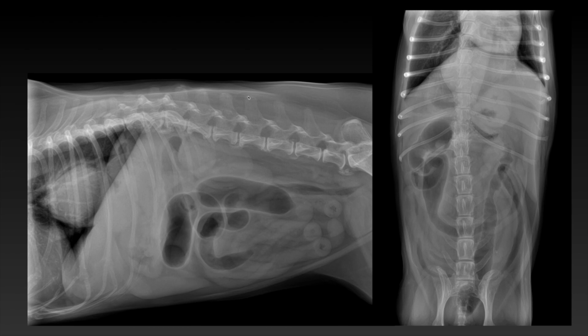The focally dilated small intestine could represent the terminal ileum. The structure superimposed with the right cranial abdomen could be located at the ileocolic junction or already within the ascending colon. An ultrasound of the abdomen is recommended to exclude a mechanical ileus as a cause for the gastrointestinal signs of the patient. The corrugation of the colon is compatible with hyperperistalsis and the diarrhea of the patient.